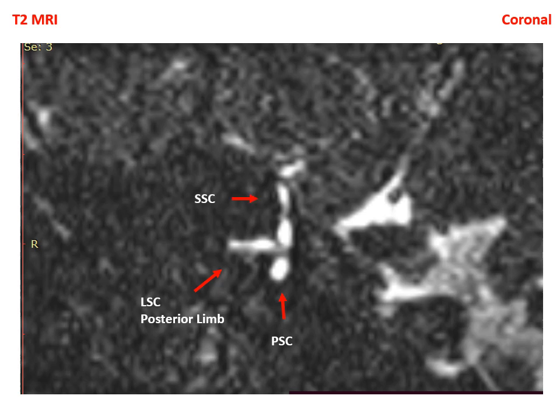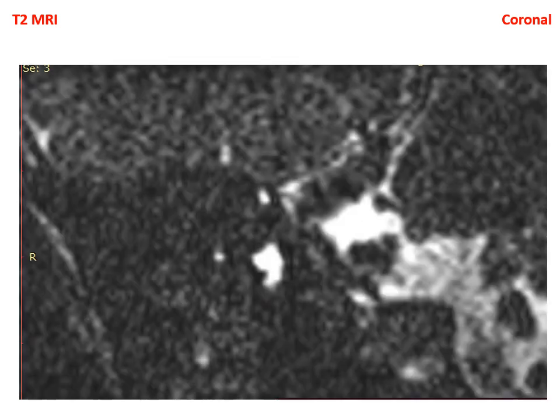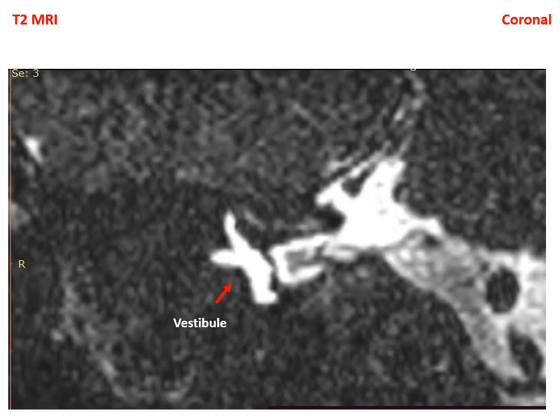And this is the superior canal. Also, the posterior limb of the superior canal opens in the common crus with the posterior semicircular canal. Then the vestibule will show anteriorly. More anteriorly, we can see the lateral semicircular canal, but the anterior limb of the lateral semicircular canal. And we can see the superior semicircular canal, the anterior limb of the superior semicircular canal, and each of these two canals opens in the vestibule independently.